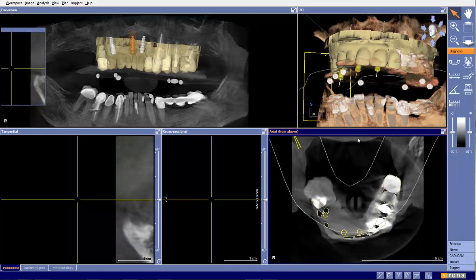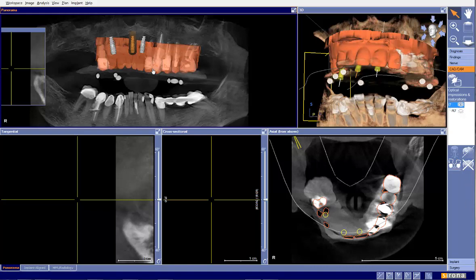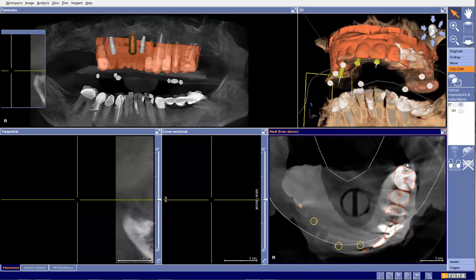So that's an option. But the beauty of having done it the other way is that now, in the case that we weren't able to do the CEREC scan integration, we could still have a guide fabricated. So if we take a closer look at this, I can see exactly why we did a classic guide scan. If you take a look here, in theory, none of these teeth are reliable. Doesn't mean it doesn't work, but reliable for CEREC integration. But as you can see here, this dentist was able to integrate the data, and as we can look through here, we can see that it integrated quite accurately actually right there.